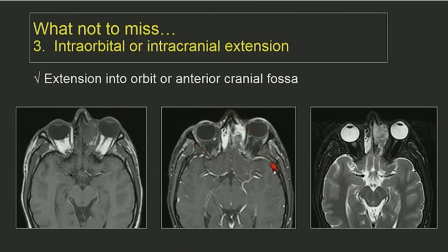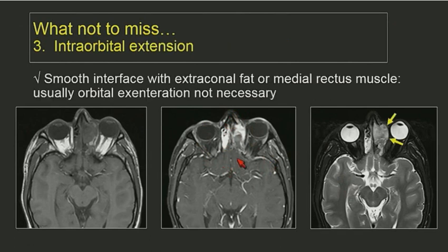The gadolinium here doesn't help me at all. Even the benign secretions in the right ethmoids enhance.